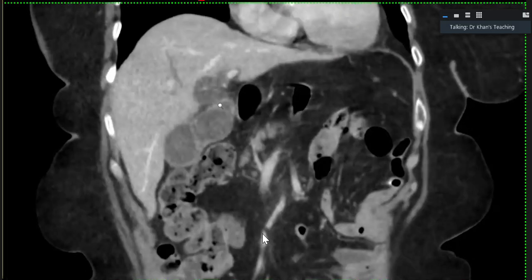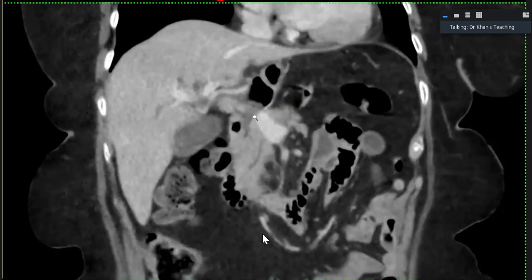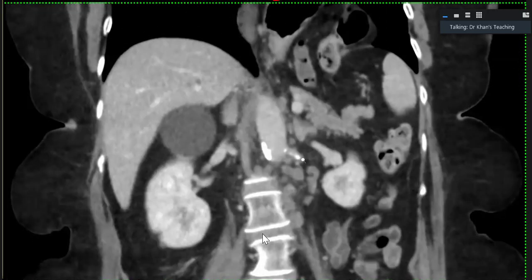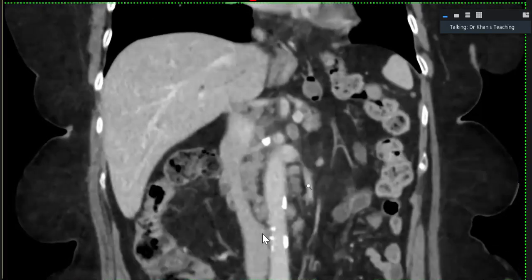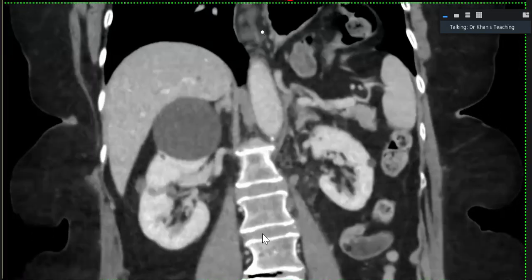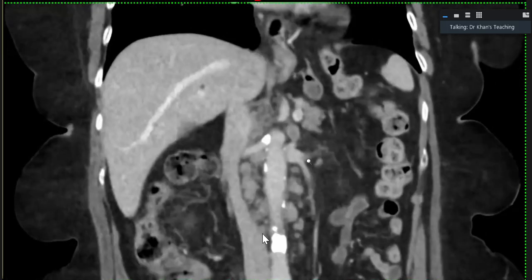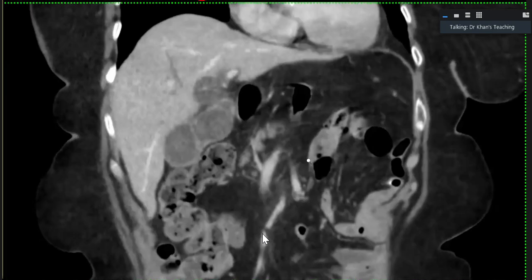A few centimeters distal to it is a cholangiocarcinoma with all of these lymph nodes. These retroperitoneal nodes, and that node here, will by definition be metastasis. Non-regional lymph nodes are taken as metastasis, and regional lymph nodes will be in the N classification of a tumor.